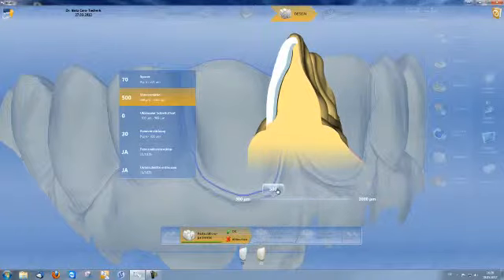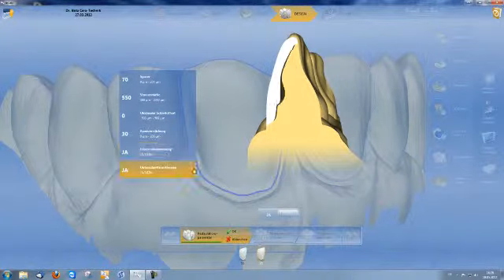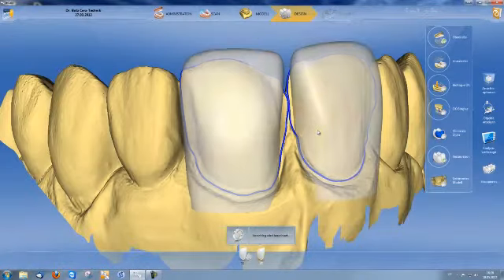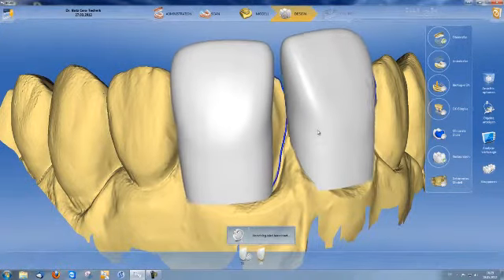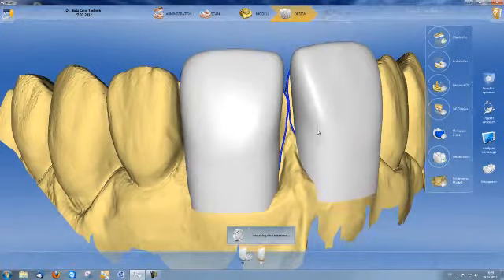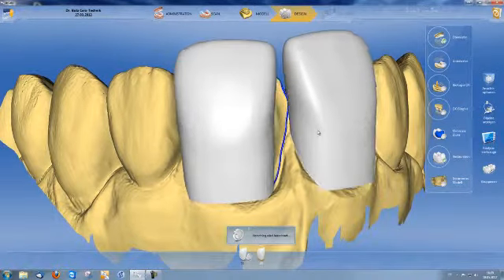and the veneer thickness, margin reinforcement, and the milling radius correction, removal of undercuts. I confirm with OK, and am given an initial proposal for my veneers. Everything below the copying line is now completed by biogenerics through to the preparation.